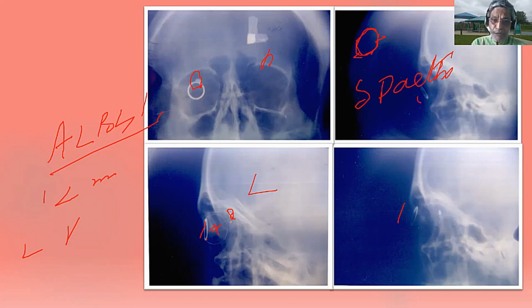Your answer is what? Sir, I constructed 24 millimeter, sir. In this case, I am finding it outside, sir. But still I am having doubts, sir. Maybe it is intraocular or extraocular. Then how to confirm, doctor? That is called the fallacy, the drawback of this procedure. When you construct an artificial eyeball on the lateral view for 24 millimeter, it need not be the same for all. Somebody can have 20, somebody can have 26. So what I have found out may be wrong.